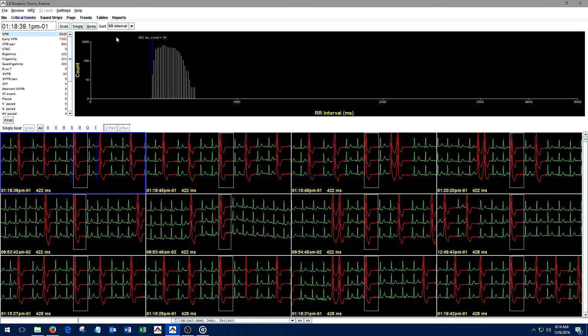As a technician, you have almost infinite control over how the analysis works and what is saved. This is intentional, as the overarching design philosophy of this product is to give the technician ultimate control and final say over how beats are handled. So how does a technician control the analysis? Let's have a brief look at those screens.